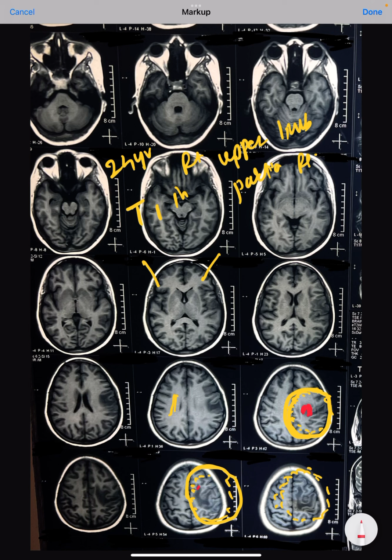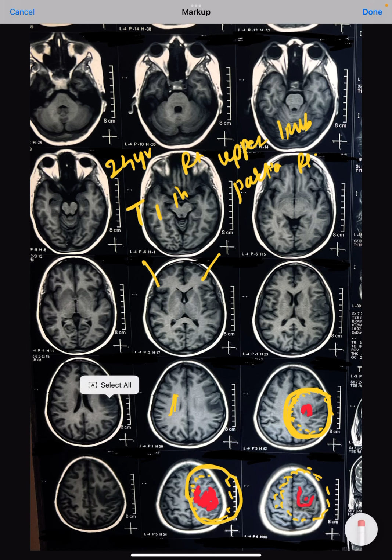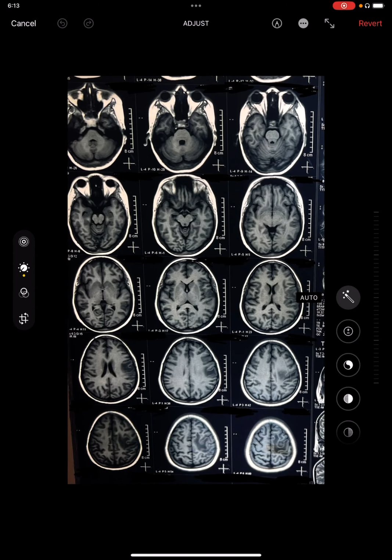So there is reduced signal intensity, you can say. It is very obvious in this area. So it means that there is some problem in this area. To evaluate it, we have other MRI images which will tell us about the exact problem.